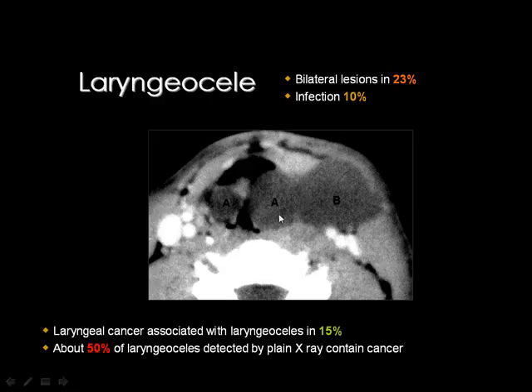And the laryngocele should contain only air, and whenever it is obstructed, it may contain air fluid level or become secondarily infected. Whatever the terminology, I say what's written in our books. They thought that the laryngocele may be filled with fluid, like this example, or air fluid level.